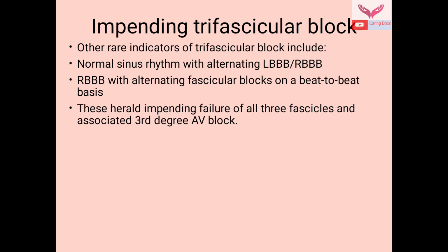The impending trifascicular block is another rare condition, and it includes normal sinus rhythm with alternating left bundle branch block and right bundle branch block, or right bundle branch block with alternating fascicular blocks on a beat to beat basis, and these herald impending failure of all the three fascicles and associated third degree AV block.